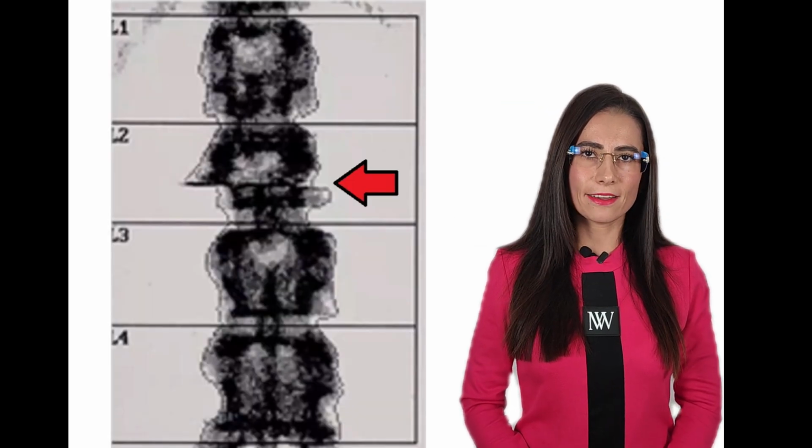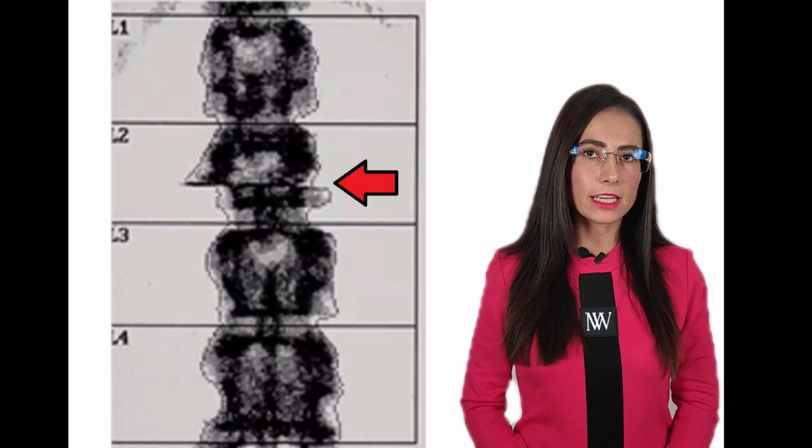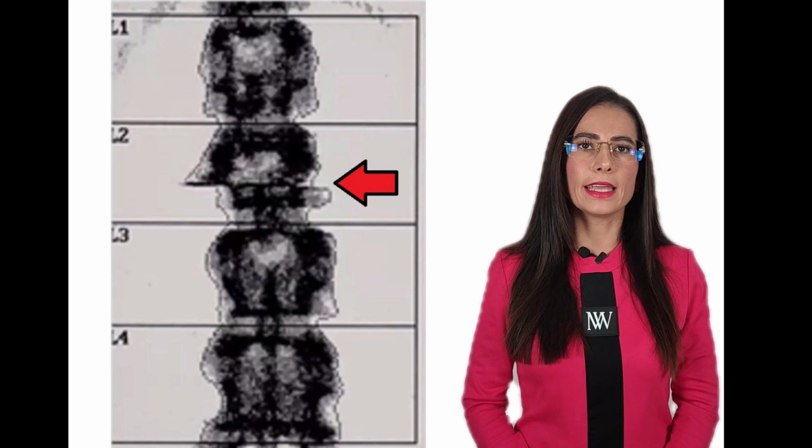Another type of DXA errors are caused by the patient. During the scan, the patient should not move. Any movement can lead to artifacts which could cause bone density higher than the actual one and result in an incorrect report of normal bone density.